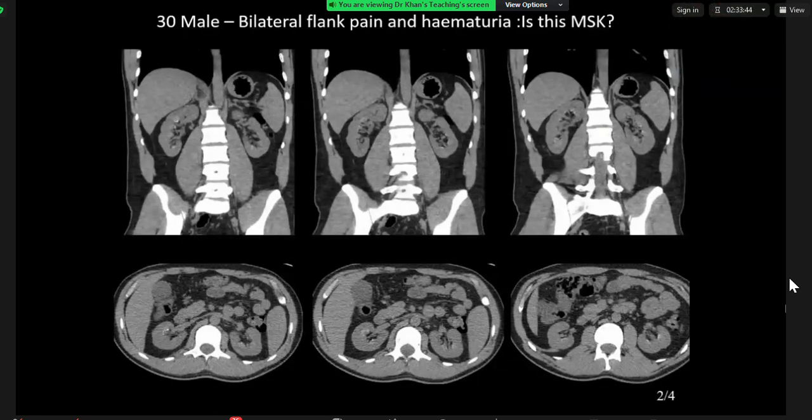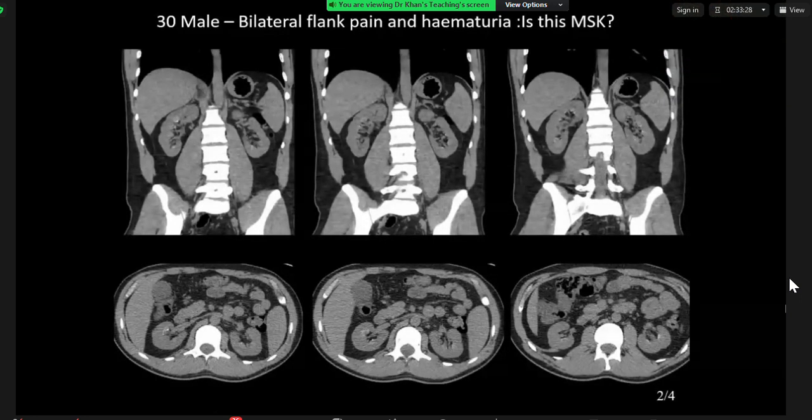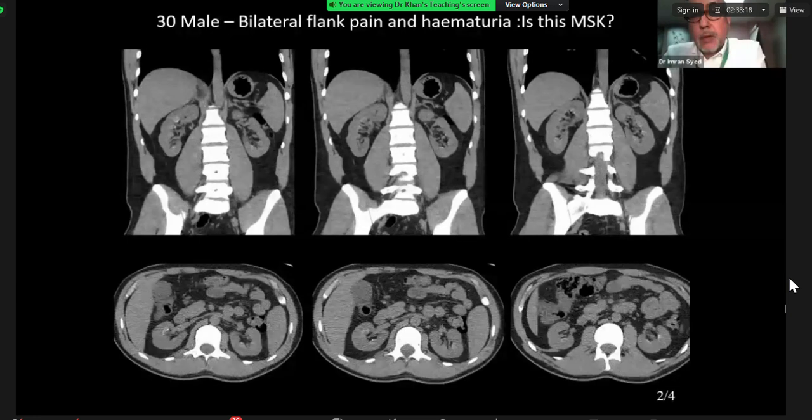Cortical is a lot less common. Okay. So cortical has a shorter differential, doesn't it, in terms of what the differential diagnostic possibilities are? Can you name two of those differentials now that you've mentioned cortical? So you can get it with chronic glomerulonephritis and chronic infections, and it can also be associated with conditions like Alport's. Yeah, Alport's, alkaptonuria, oxalosis.